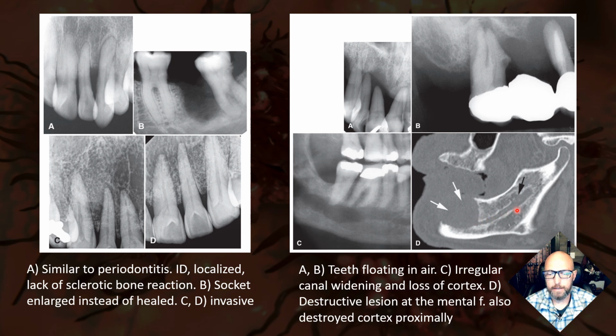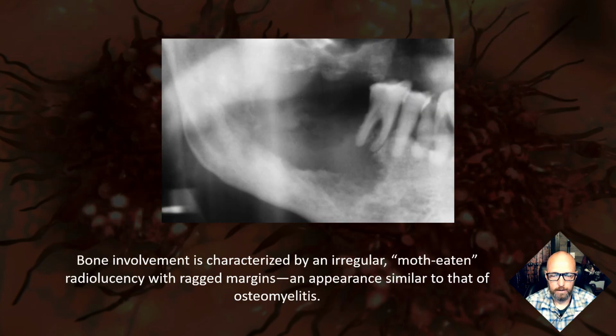And this is perineural spread, showing that, okay, what likes to do perineural spread? Malignancies. And so bad signs in this case, even though some of it looks well defined and might make you first start thinking it's a benign thing, look for these other signs. Look for that ragged border. Look how destructive it is. If this were some large cyst, you'd expect it to be more kind of sac-shaped and just have that nice smooth cortex around it. This is an image I just showed you, just blown up now, showing that ragged border, those trabeculation left behind, moth-eaten appearance you could call this. All these things should lead you toward thinking malignancy.